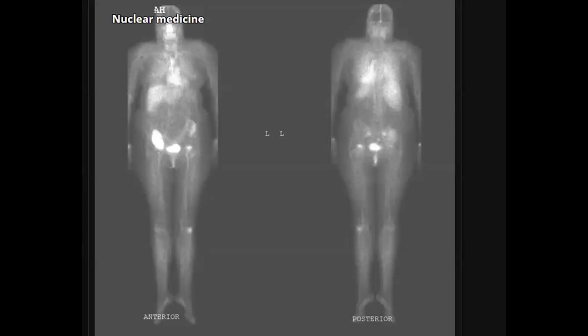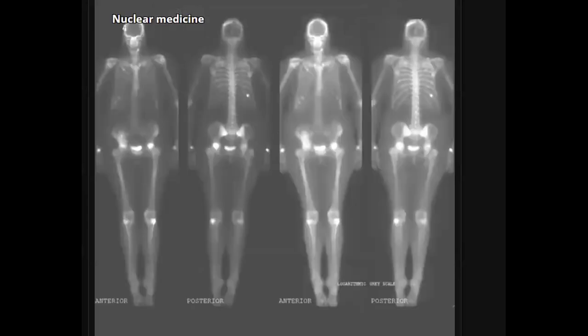This patient has a history of leukemia, and again he has pain in both hips. So they did for him this scan. Does anyone know the name of the scan after we showed many studies today? What could it be?